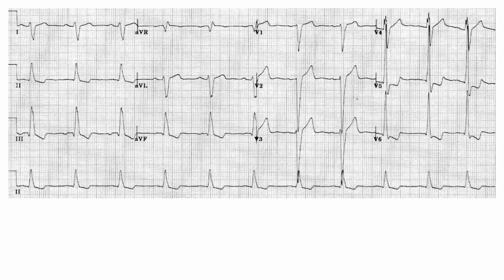The last part is the biventricular hypertrophy. Now, biventricular hypertrophy incorporates the voltage criteria of both LVH and RVH. Okay. So, when you do suspect a biventricular hypertrophy, if you see this ECG, here it is not very clear, but one thing you can appreciate is that there is left ventricular hypertrophy, and if you see the axis, okay, yes.